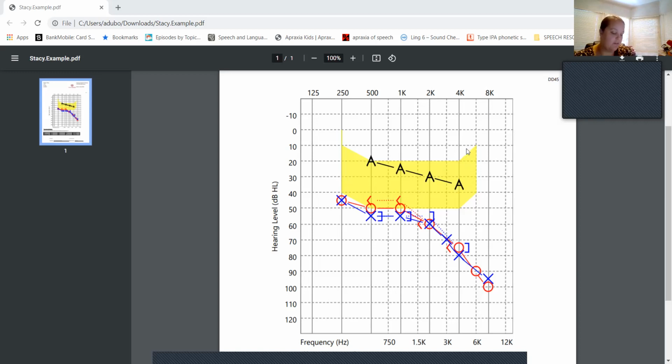Whereas our vowels, well, like Z is not a vowel, but over here, the furthest to the left are low frequencies. Think zzz, so you can hear how low it is. Okay, so that's what the speech banana is. It's where all the letters, all the sounds come into play, and they all have different frequencies. Some come out louder, and some come out softer.